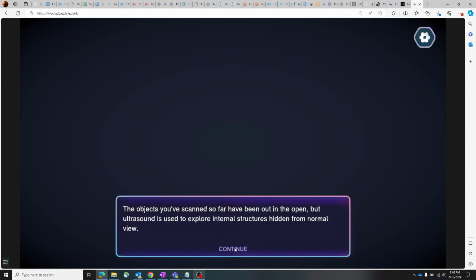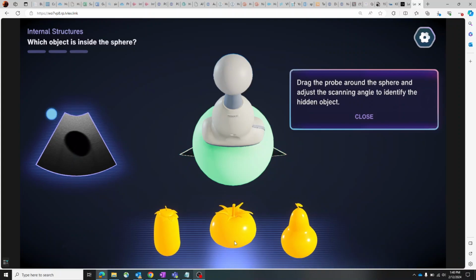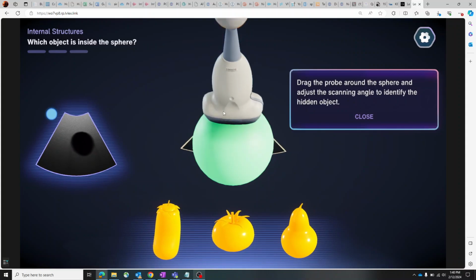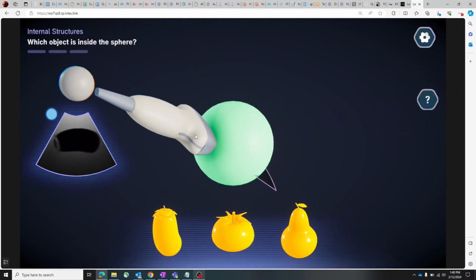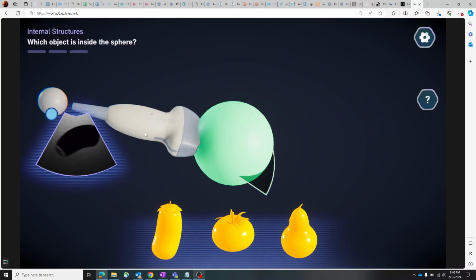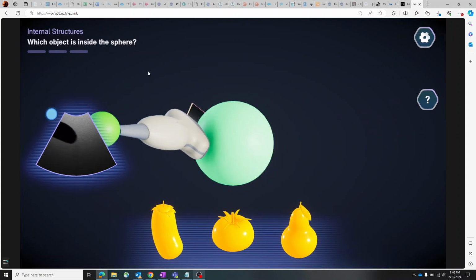And so we can allow the user here to drag and rotate it around, so you can see some details, and we've pointed out some specifics of what you want to keep in mind when you're holding the probe. Obviously, there's no one correct way to hold the ultrasound probe, but it's a matter of getting a comfortable grip and keeping yourself anchored to the skin.